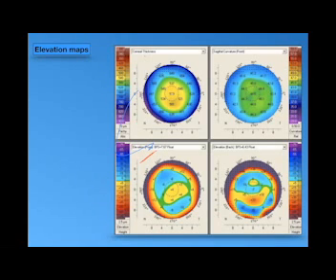It could be normal up to +15 in both myopic and hyperopic. And in the margin from +15 to +21, it could be suspected, but it's more accepted in the hyperopic more than the myopic. But beyond the 21, it's abnormal. It's not accepted in both because of the type and the amount of refraction of the rays coming from the machines related to the curvature myopia and the curvature hypermetropia, the nature of the refraction of the light in both corneas.